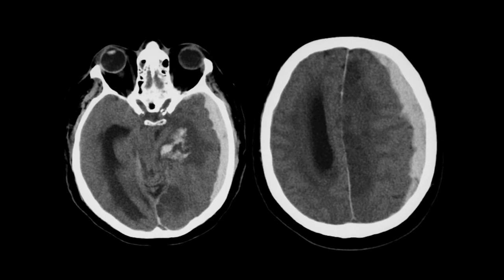This patient has a large left subdural hematoma, and they have loss of gray-white differentiation in the distribution of the anterior cerebral artery on the image on the right, and in the distribution of the posterior cerebral artery in the image on the left. And this is as well as trapping of the right lateral ventricle. This is due to arterial occlusion from subfalcine and transtentorial herniation.